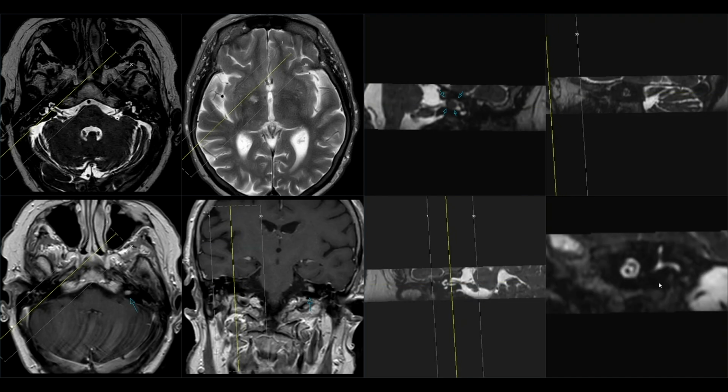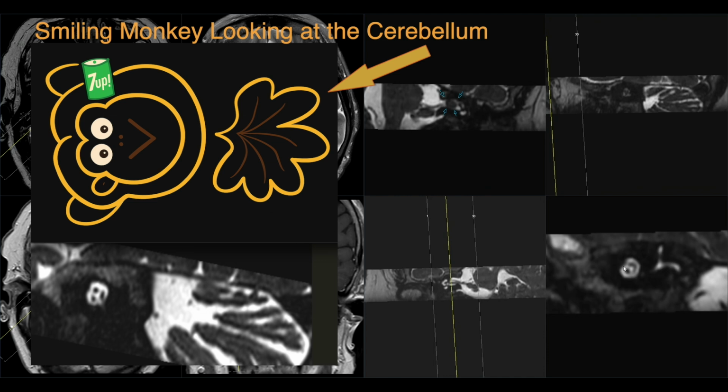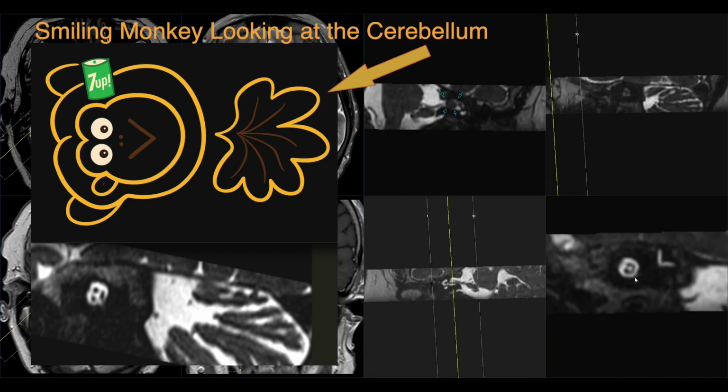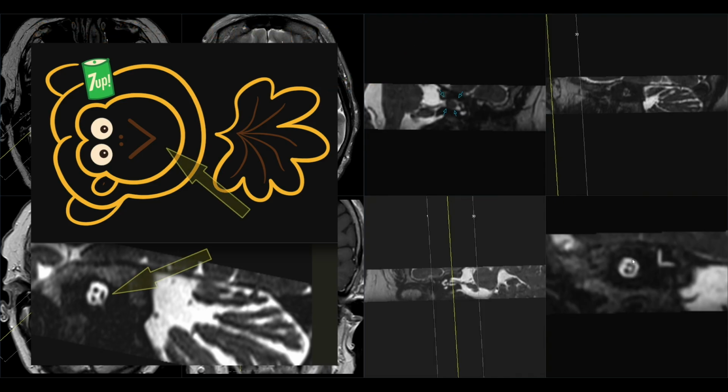Now on some projections you can imagine that it looks like a face of the monkey, so indent in the forehead and here a face. And on some sequences it depends on the angle. This one is angled like we have it, so you can see small eyes and the mouth of the monkey like this. Now mouth of the monkey is in the shape of V letter, and this is the vestibular nerve.